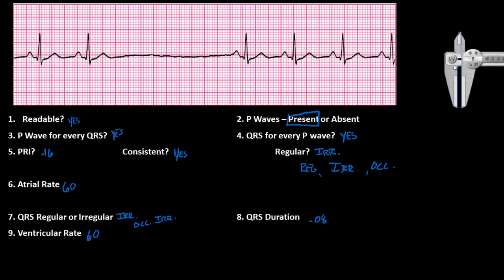So what do we have? Well, if I were to answer all of these questions, which I just did, we would know that this is so far a sinus rhythm. Okay? It's a sinus rhythm.